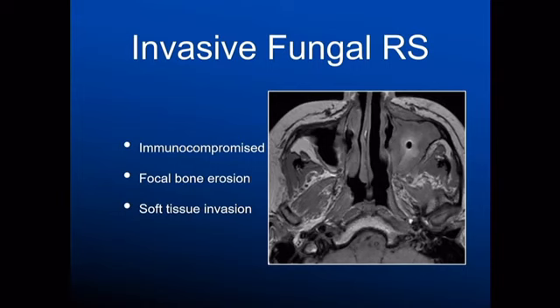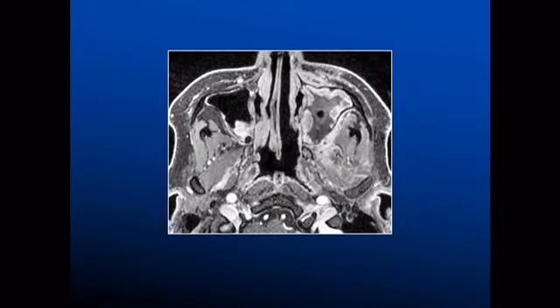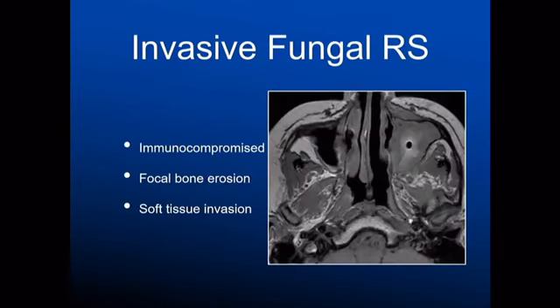So one of the commonest places that you see invasive fungal sinusitis in the first instance is in the retromaxillary fat. So you get abnormal inflammatory change in that retromaxillary fat. That is what you're looking for on the CTs. Everyone thinks that it's going to be some really aggressive looking process, but it's often quite subtle. I'll just go back to that one. So this loss of fat there in that retromaxillary region is really the only sign on this that you can say that there's invasive fungal sinusitis.